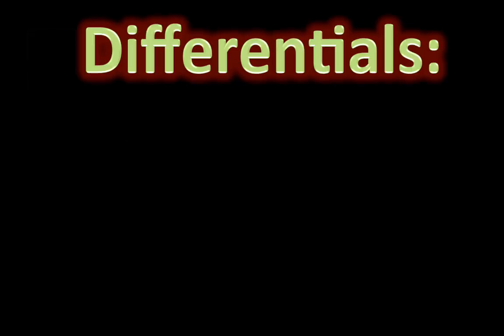So given the appearance, what are the differential diagnostic possibilities that you should think about if you're on call? Although this case was sent to the on-call resident with a question of rule out stroke, this is not the first thing you should think about seeing the appearance. Given that it's multifocal, bilateral, and in particular it involves the medial aspect of the temporal lobes, you have to think about an infection. And a famous infection that looks like this is herpes simplex encephalitis.